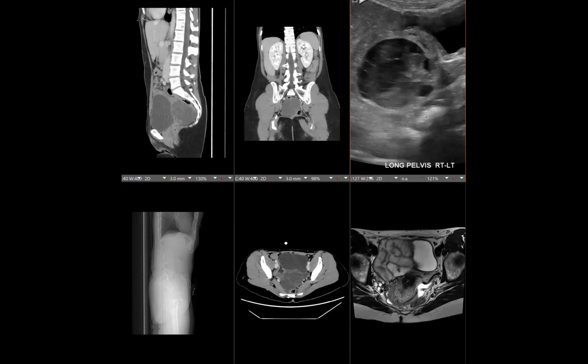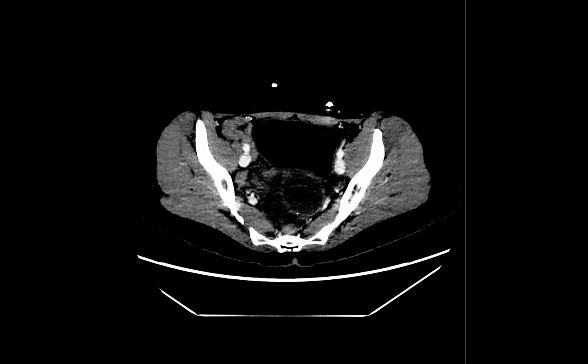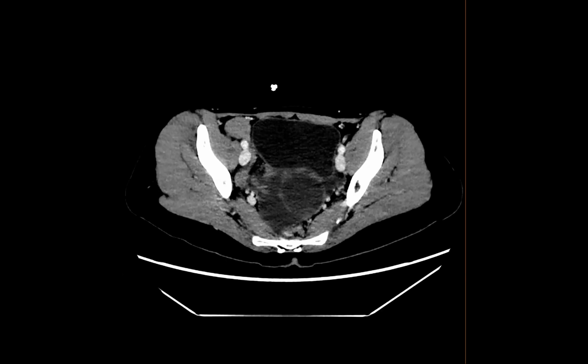So when you say there was a 5 centimeter hemorrhagic cyst in there too, that makes sense because it did look like there was some kind of lesion. Yes, and there were also peripheralized follicles. Got it. Okay. Yes. So I'm going to share my screen again. When I saw this, there's actually a layering, a very subtle layering density in there.